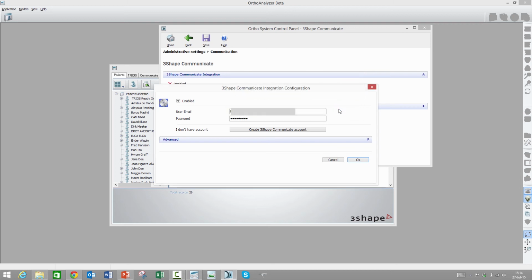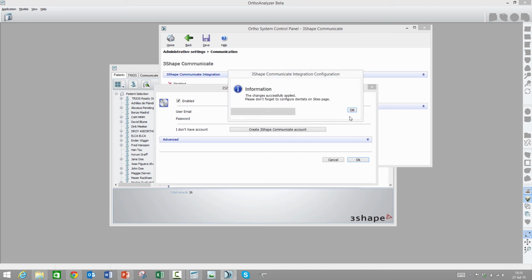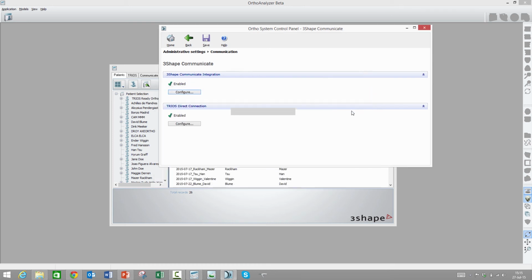Say yes. And there will be a pop-up box sometimes where you need to say yes a couple of times. You just do that. It's to create folders and stuff like that. Okay, and again, click Save for the final changes, and you can now close the control panel again.